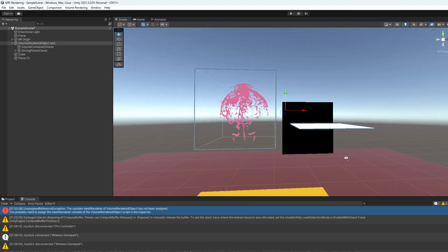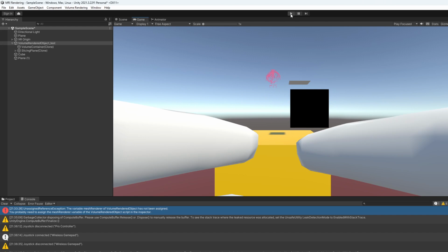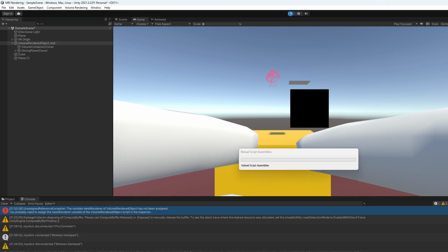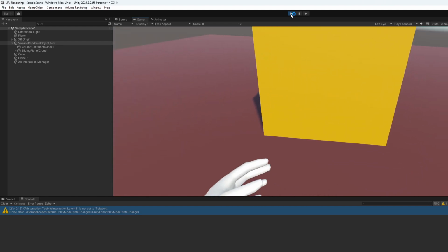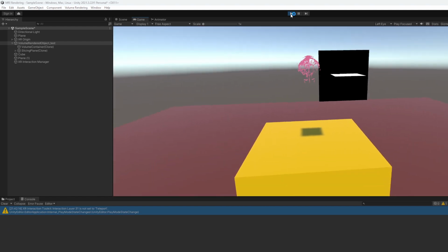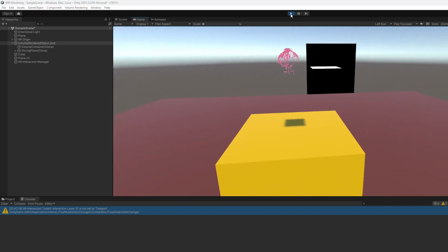So I'm going to load up into VR. I have a Quest 2 headset that I've been using for development, so I've actually been able to test this in VR, and hopefully you'll be able to see what I see. I have hands and everything set up, and I'll demo that when I get into it. If it works. Just loading in now on my end. Oh, jeez, I need to stand up. So hopefully you can see that. Yep, looks like you can. I still have the Oculus pointers on. I don't know how that happened.